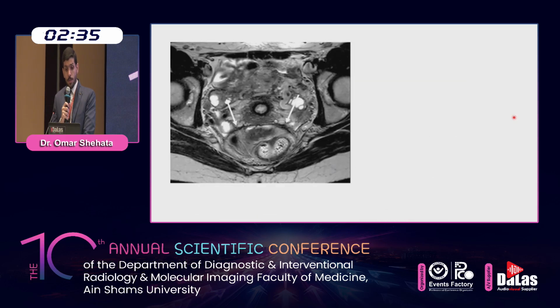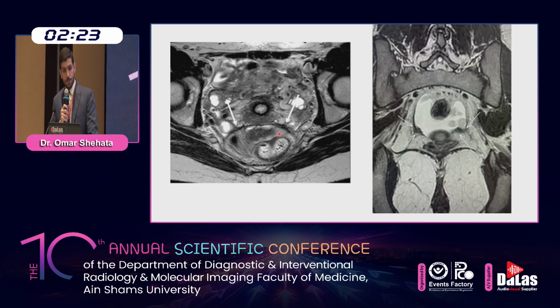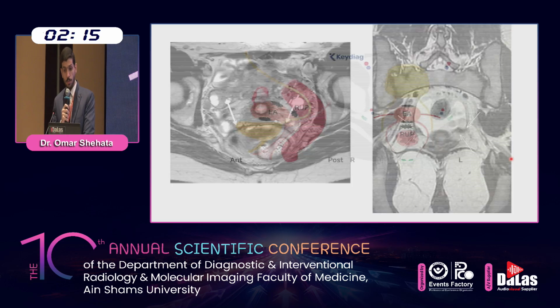The axial T2 MR image shows proximal uterosacral ligament thickening, as shown here, with low signal intensity and irregular margins, known as arciform pattern. While in image B, the coronal T2 weighted image demonstrates asymmetric bilateral thickening of the proximal third of the uterosacral ligament.